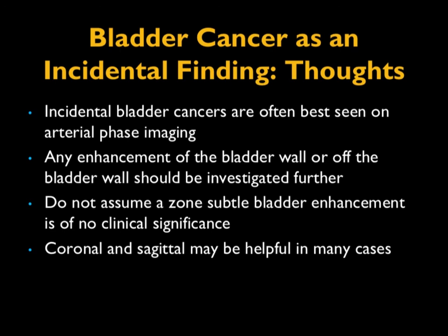And so bladder cancer, when we started looking carefully, is not an uncommon incidental finding. And particularly with CT today, where we're giving lots of water to distend the bladder, you're going to see more of these cases. Also, as you do arterial phase imaging, you're going to see more of these cases because although they're not hypervascular, they're vascular enough that against the urine, it stands out nicely. We make the point, and I'll show you examples, that any enhancement of the bladder wall needs to be highly suspicious for bladder cancer.